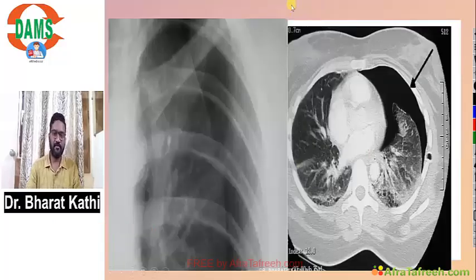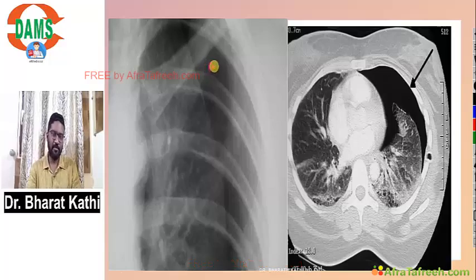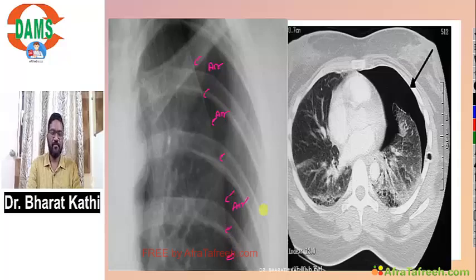And always, even in any emergency situation, when the patient is having acute shortness of breath and chest pain, always look for any possibility of pneumothorax. So you have to see the compressed lung margin. And now after the advent of CT chest, it is very easy. This is the right lung, this is the left lung. So this is air, and you can see the compressed lung margin.